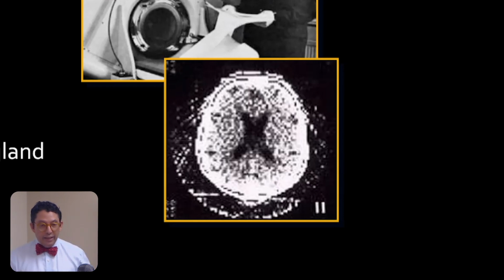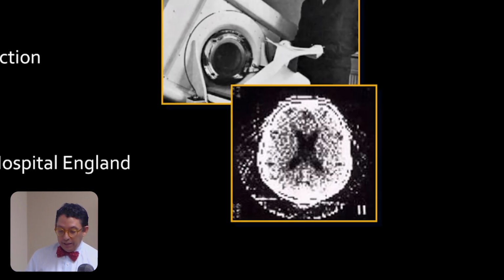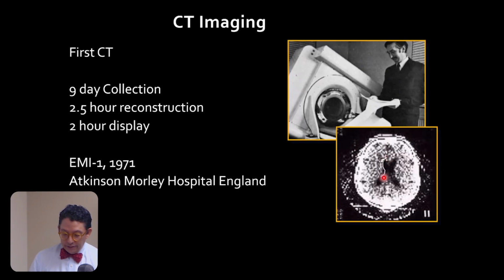In this image, you can see that it's oval shaped. That's a head. So the first CT was actually a head. And you can identify inside of the head a space right here, which is dark, and that space that I put right there, which is not enhancing, are the ventricles.